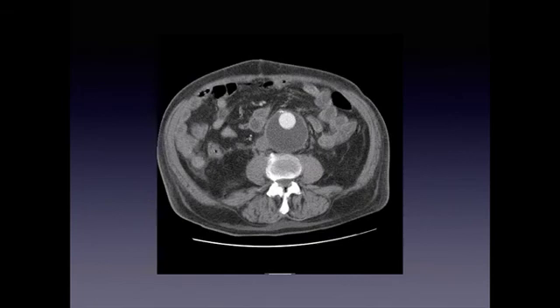This is just a CT cut where you can see the entire aorta, and then you see the lumen, which can be very deceptive because you would want to measure that lumen, which is where that dye is. That's perfectly circular there, which looks normal. But if you look back behind it, that's thrombus, and then you want to measure all the calcification. So you don't want to miss that.